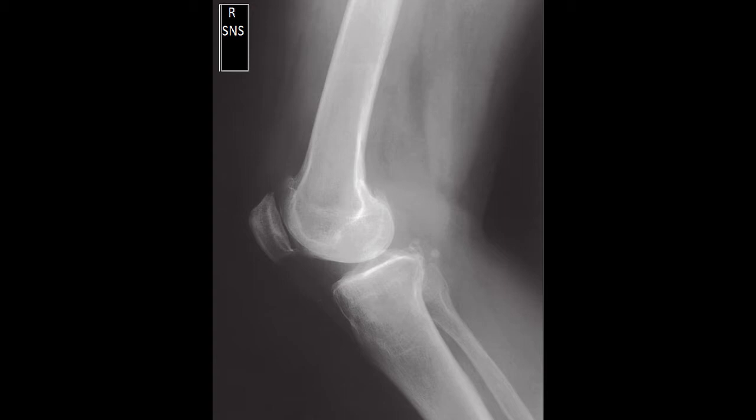So you can see that it's properly collimated. Her knee is flexed 20 to 30 degrees. You don't want to do that if you suspect a fracture. Then you'd only have them flex about 10 degrees. The fibular head and the tibia are slightly superimposed. The patella is in lateral profile, so that's good. And you can see the open patellofemoral joint space.